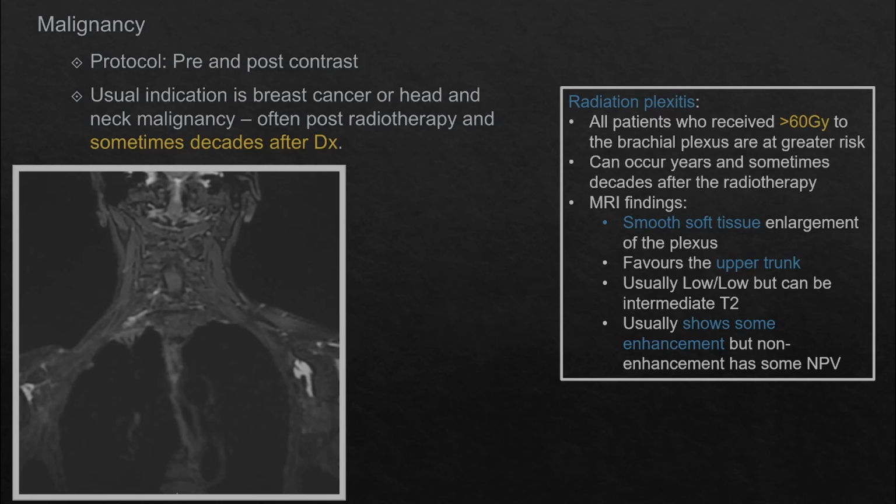It often shows some enhancement on post-contrast sequences, but if it shows no enhancement, this can have some negative predictive value, and as such we do usually use post-contrast imaging in these cases.